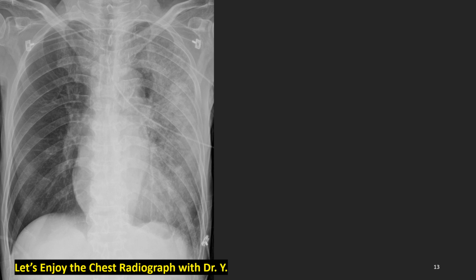This film is quite interesting and somewhat philosophical. Let's enjoy it very slowly. What do we see? Diffuse airspace consolidation and air bronchogram on the left side. Somehow we do not know where, in which lobe: upper lobe, lower lobe, or whole lobe. But if we look closely, we have some clues.